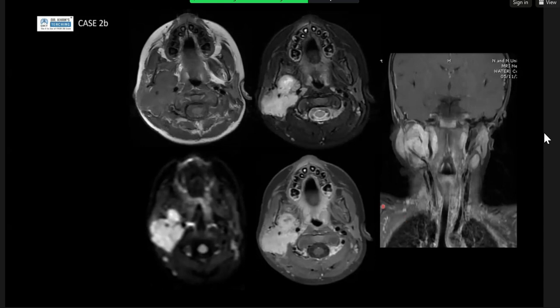Okay. And what do you think about this region in front here? Sorry, can you see my pointer? Yes, I see this in the base of the tongue. In this anterior part, I see some high signal, thickening of the mucosa, of the pharyngeal mucosa anteriorly.